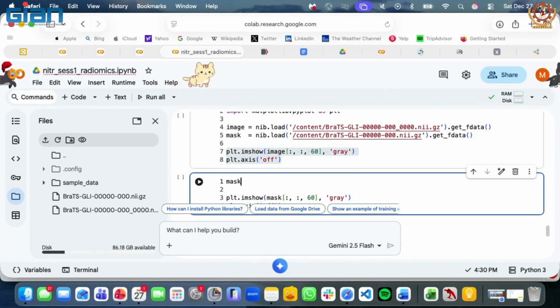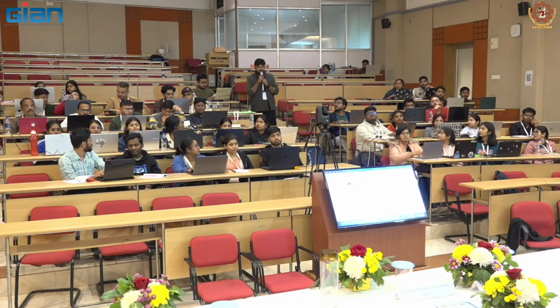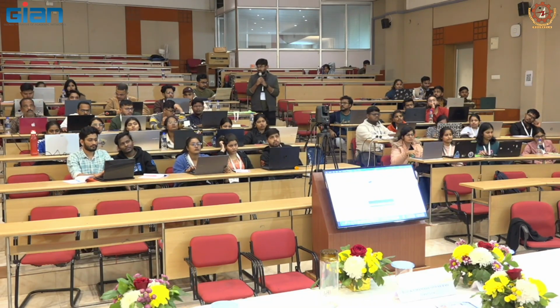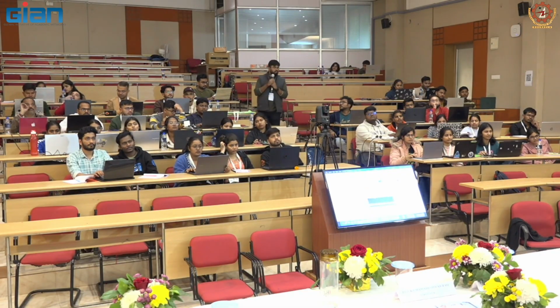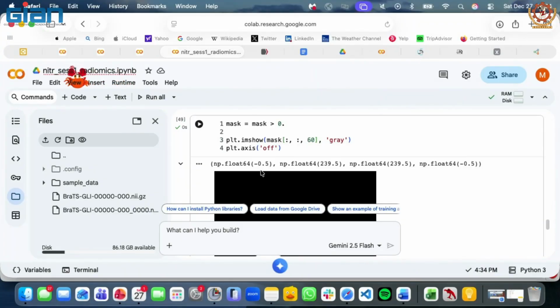Guys, actually, you have to do the same thing, okay? Just don't sit. Just do the same thing, whatever is going on the screen right now. But I will share these files with you again, with all the modifications. Still, you actually have to practice. Don't feel left out. It's good to get your hands dirty by doing basic things like visualization.